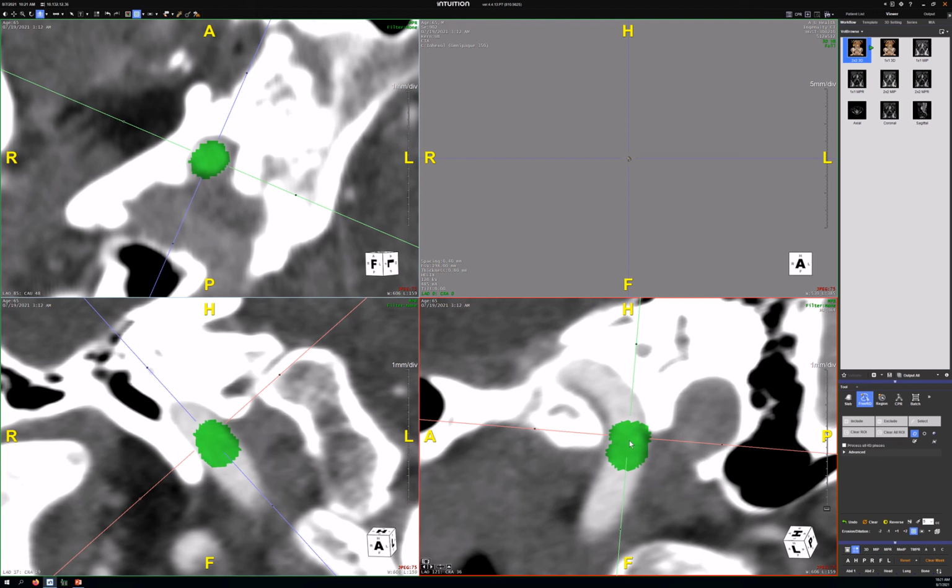So one thing we're going to do once we get all the way through the skull base is to fix it voxel by voxel. Now this is going to take us a ton of time, but once we feed this segmentation data to the AI, it'll learn how to do it, and then hopefully humans won't have to do it anymore after that.